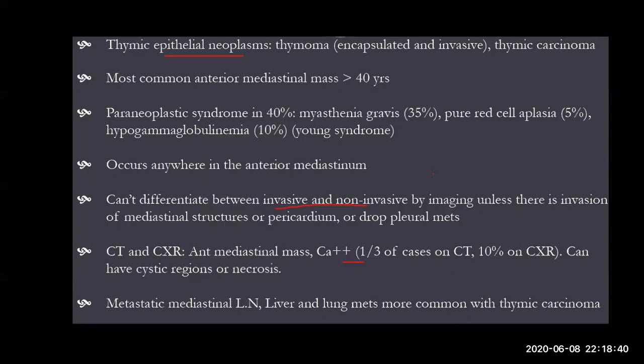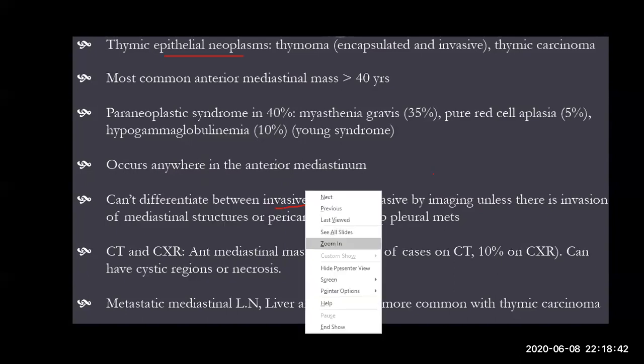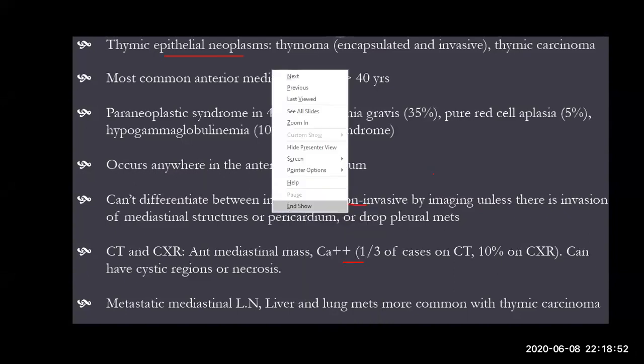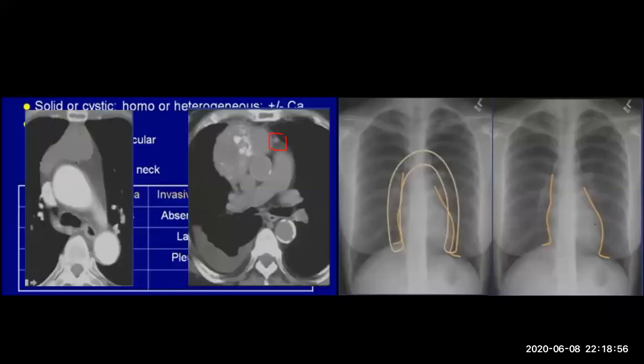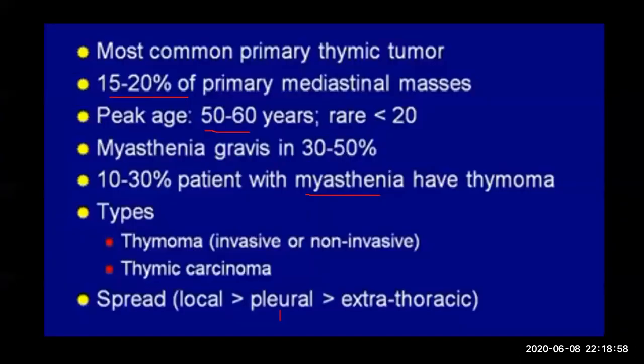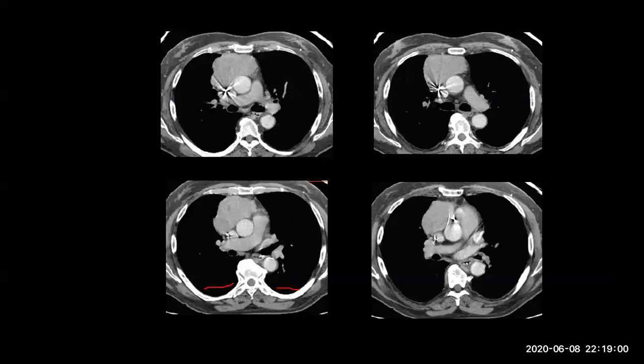No, doctor, just a question about the chest X-ray. I saw reticular changes in the lung on the chest X-ray. So do we also need a lung window? You see what? Reticular change in both lung zones, not this chest X-ray, the previous one.